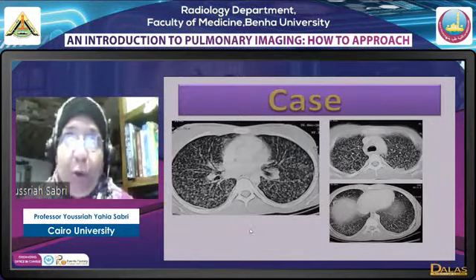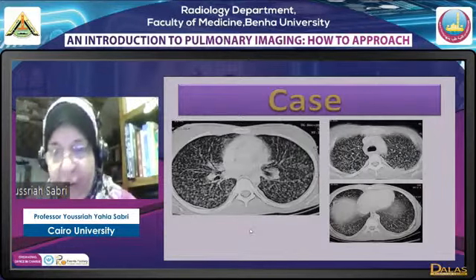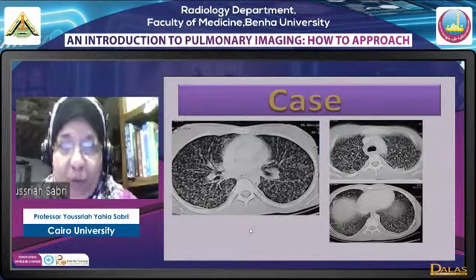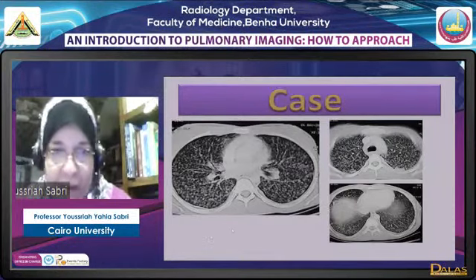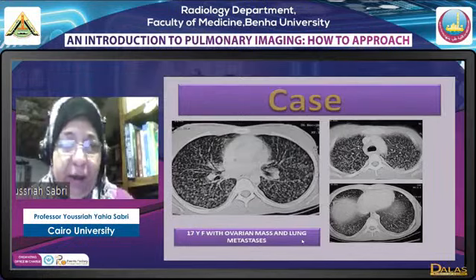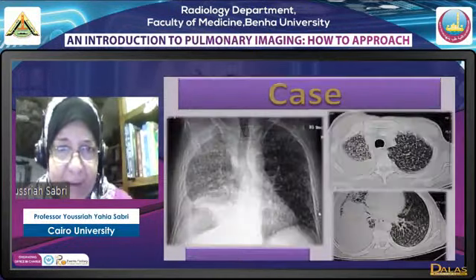We don't use the word shadow in CT because we don't have shadows in CT. You see the actual lesion. So in CT, this is miliary pattern. In plain X-ray, it's miliary shadowing or miliary pattern. This is miliary, which means I'm having numerous micronodules. Okay, this was a case actually of a 17-year-old female patient with ovarian carcinoma, and these were metastatic.